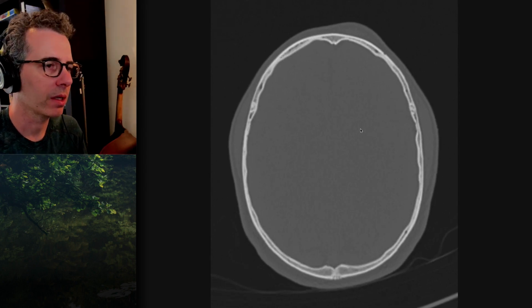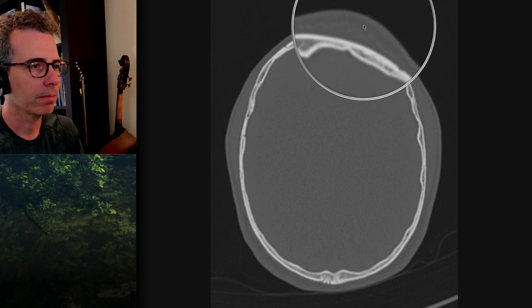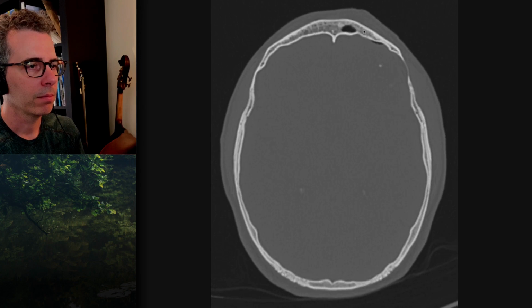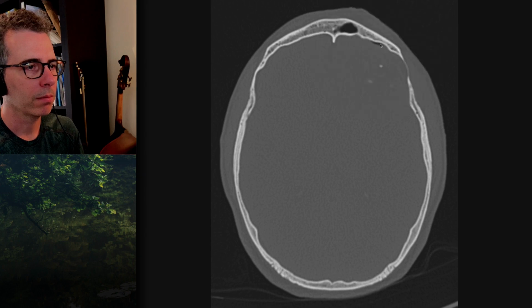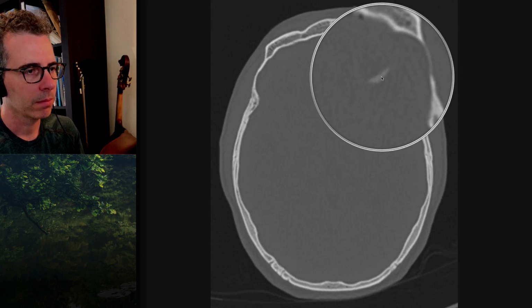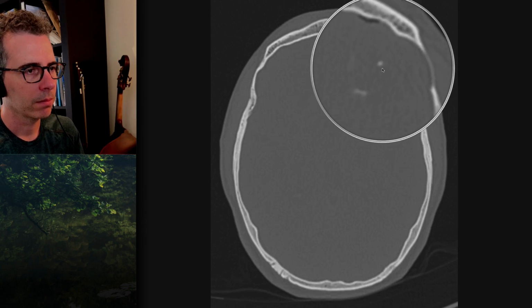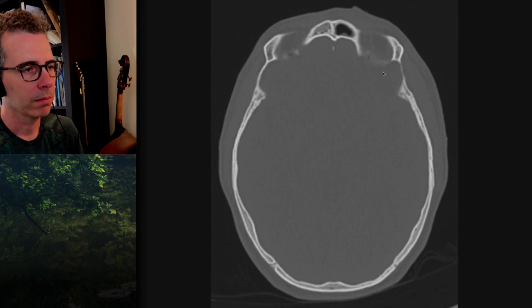I am, yeah. Good. And there's some swelling over the left frontal bone with a subcutaneous hematoma. And as we track more inferiorly, there's a rim of pneumocephalus deep to the inner table of the left frontal bone. A bit further posteriorly, you can see some flecks of material with similar attenuation to bone. So it could represent bony fragments or amorphous calcification in that left frontal lobe area. And then coming a bit further inferiorly, another locule of pneumocephalus.